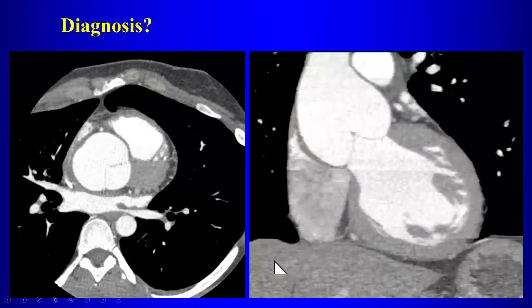Now, this is another abnormality that is commonly associated with aortic valve regurgitation. What is this patient's problem? Well, the aorta is dilated here down to the aortic root, right? So what's the underlying problem here? What is this sign called? Tulip bulb sign.